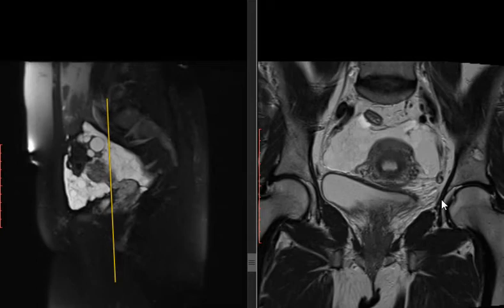This, almost surprisingly, is a very rare thing called benign multicystic peritoneal mesothelioma. Biopsy proved it. It was removed by surgery, and at follow-up there is no recurrence, and she is doing well. Yes, benign multicystic peritoneal mesothelioma. Mesothelioma came to my mind, but I mean, who would think of mesothelioma in the pelvis?